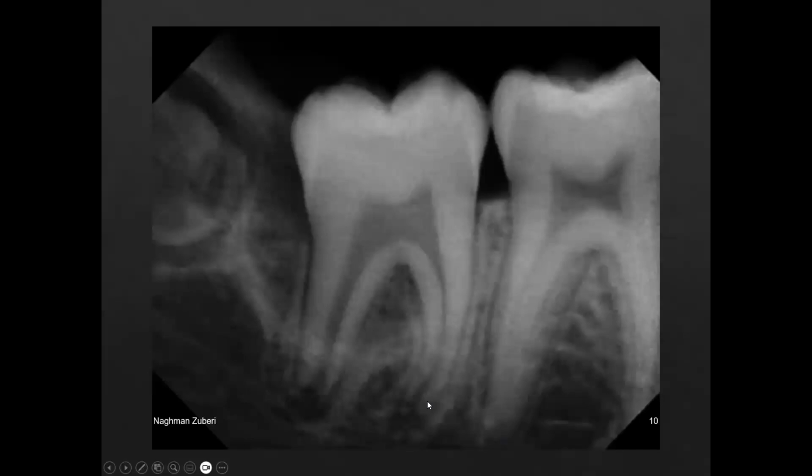Here we can see another case, and we can see that one tooth is still in the crypt. It is developing. It has just recently erupted, so the apices are not closed. And we can see the interdental area. Remember that if there is no periodontal problem, the crestal lamina, this is the crestal lamina, will be radio opaque, and there is no radiolucency. The corners will be very sharp when joining the lamina dura, and will have the same radio opacity as the lamina dura.